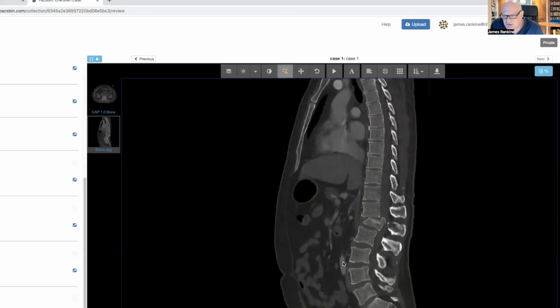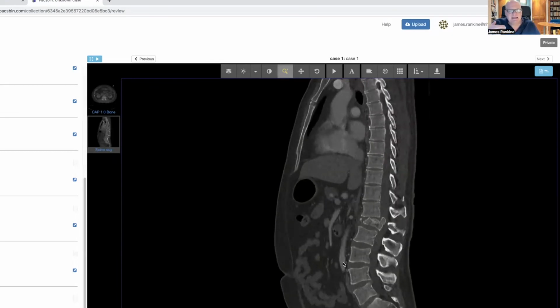So a fracture that you can see on a number of sequential axial slices means that the fracture is running longitudinally. If it was running horizontally, you, of course, wouldn't really see it on the axial slices, because one minute you'd be on the fracture and the next minute you'd be off it. But you would see the horizontal fracture on sequential sagittal slices.